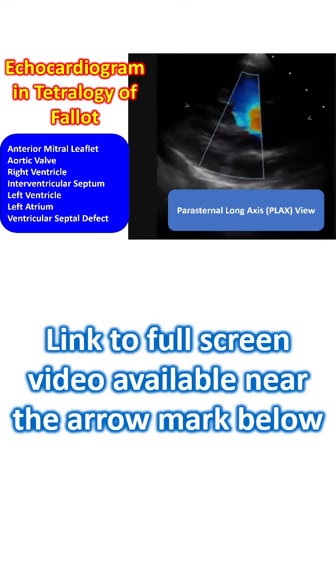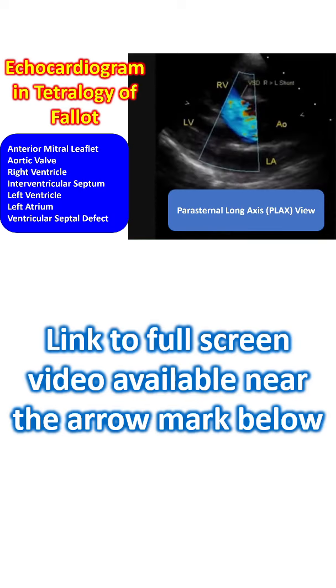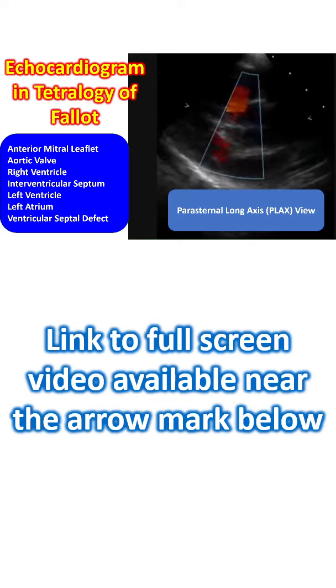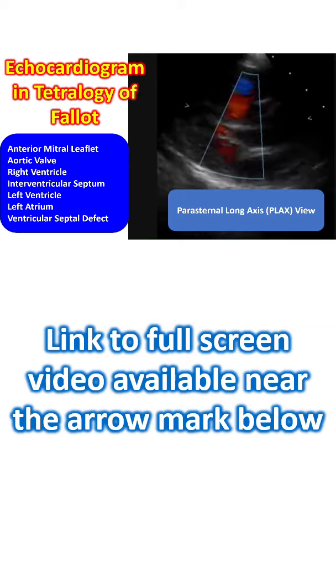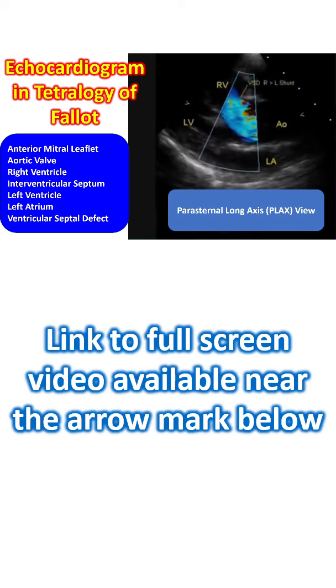Color flow mapping shows blue colored flow from the right ventricle across the ventricular septal defect into the overriding aorta. This is the right-left shunt characteristic of Tetralogy of Fallot. Another view had shown right ventricular outflow tract gradient suggestive of infundibular obstruction.